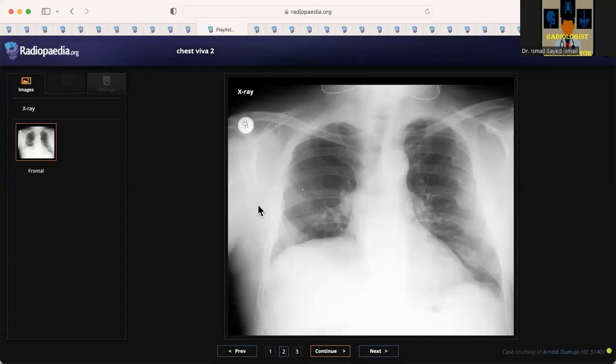So if this is a routine chest X-ray and there are any previous images, I will compare to see if this is a new abnormality, especially in the right scapular region. And if this is new and the patient is a male, I will be worried about sclerotic mets from prostate CA. If it's a female, I would tell the patient, yeah, sorry to interrupt.